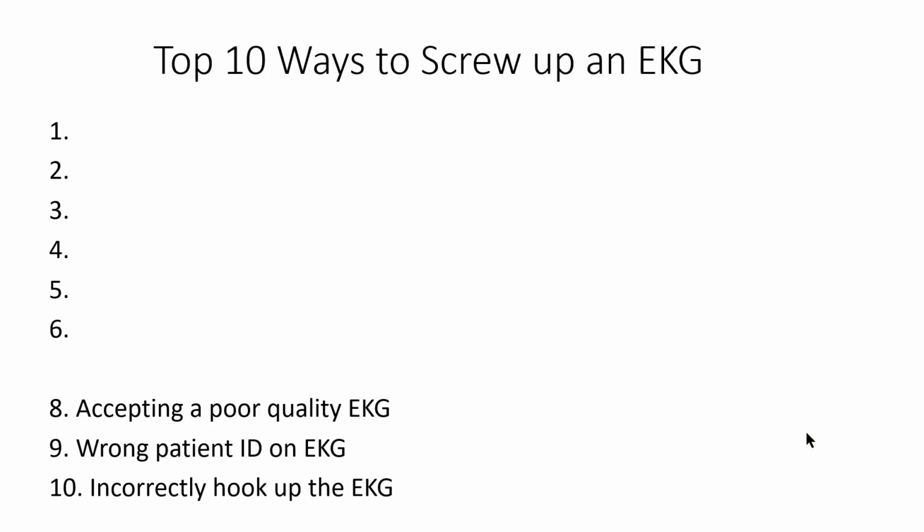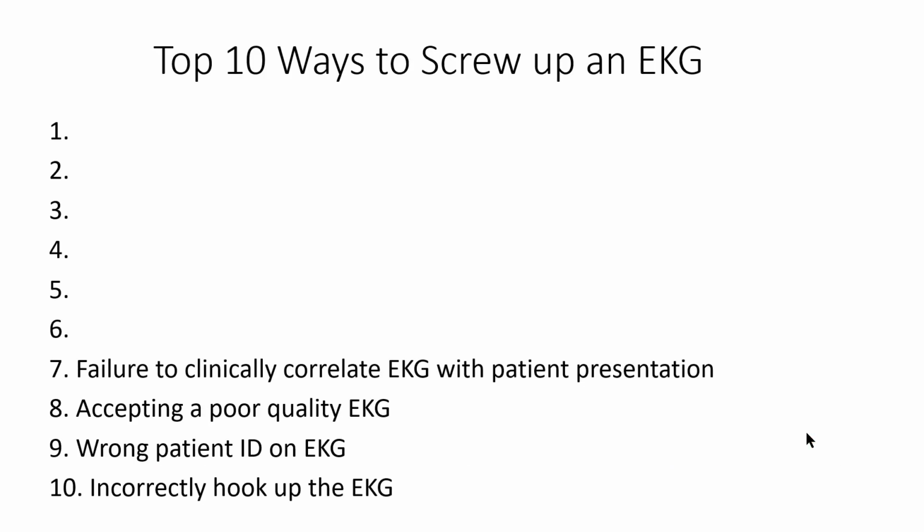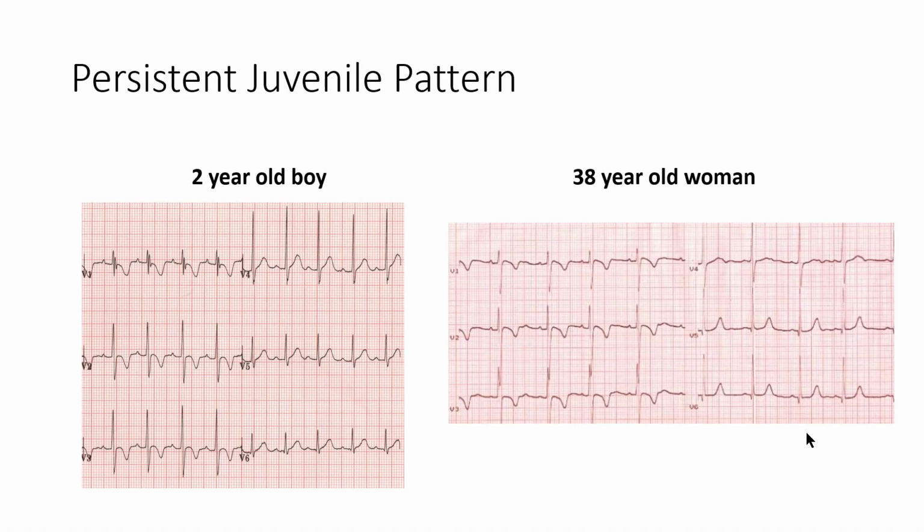Next up on ways to screw up an EKG, failure to clinically correlate EKG with patient presentation. So on the left-hand side, you can see in V2 and V3, here and here we have these inverted T waves.